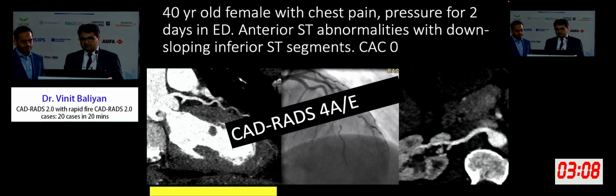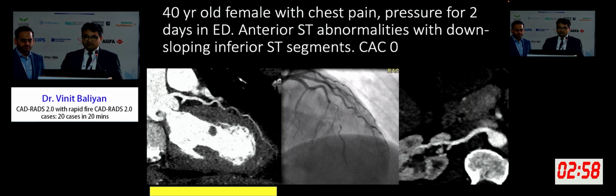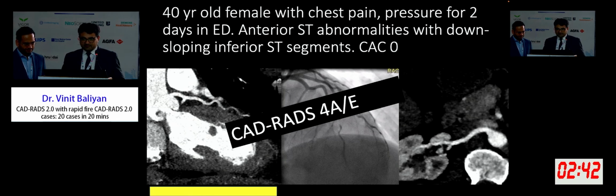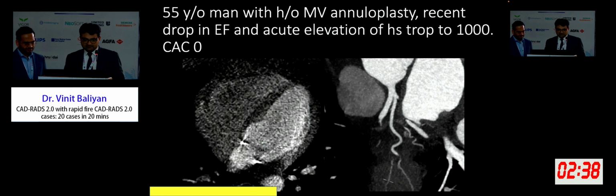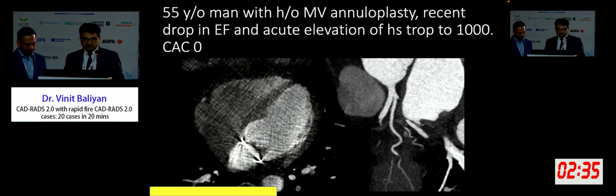That could have been a differential, yes. I mean, that's true, it could have been the case, but if I showed you the run of this angio, the contrast never washed out from this dissected segment. And yeah, young women, renal artery abnormality, but it could have been a thrombus. And yeah, actually, there is another case.